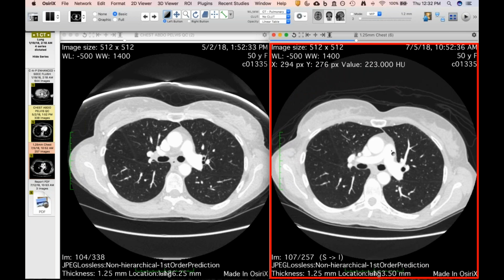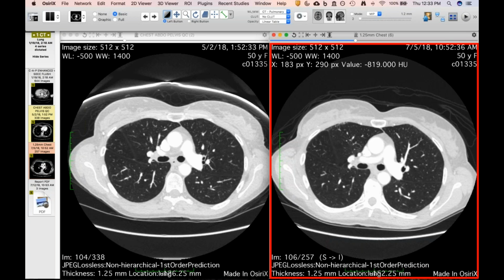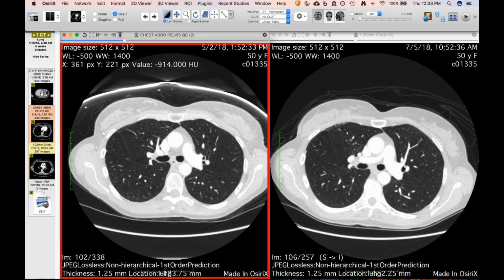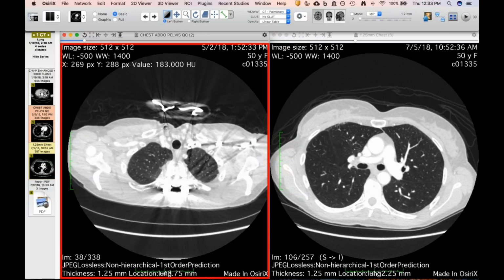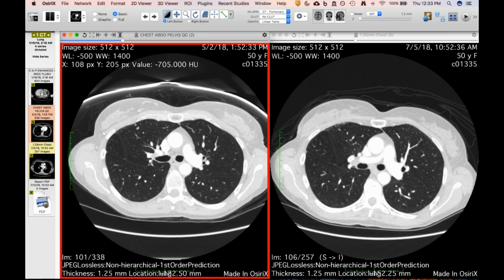Huh. That's cool. So I think David has a thought on the case. If she got chemotherapy, or could it be because, and I don't know how they did the radiation, but if they did a stereotactic, it may be possible that some of that pre-primed lung got a little bit of dose, but it was already enough to push it over and re-trigger the injury. Yeah, I don't know if they did a stereotactic or just conventional, like anteroposterior up here, but it's certainly away from here.